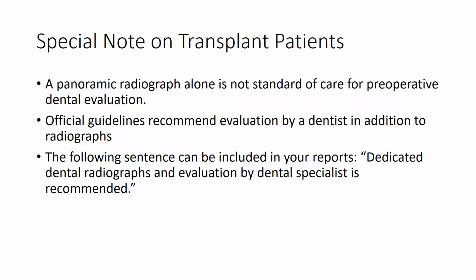So I just want to take a second here to mention something about the panoramic radiographs that are ordered prior to cardiac transplantation. A panoramic radiograph alone is not standard of care for preoperative dental evaluation, and official guidelines recommend evaluation by a dentist in addition to radiographs. So you can pretty much include in all of these reports, if you want to, the following statement that says, dedicated dental radiographs and evaluation by a dental specialist is recommended.